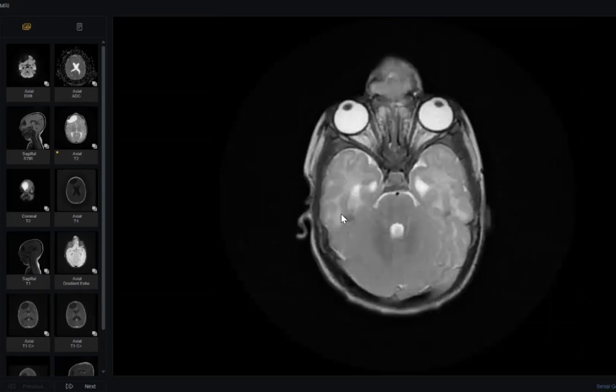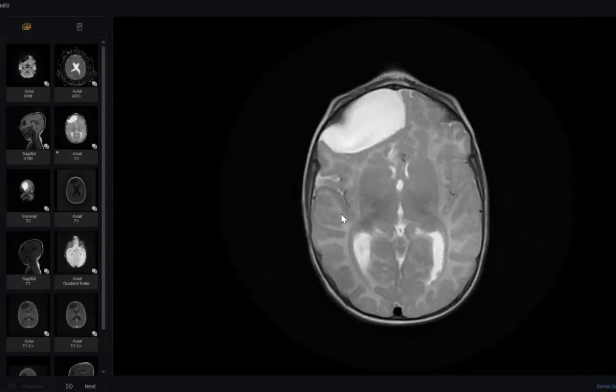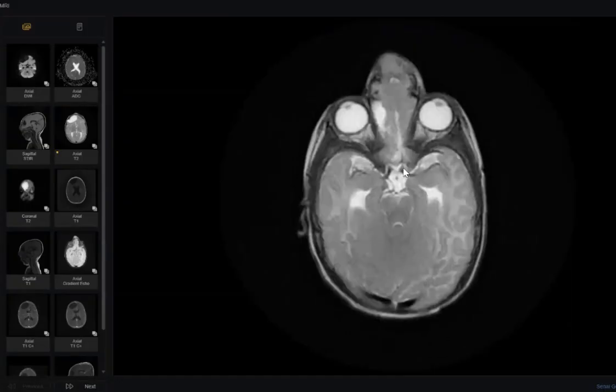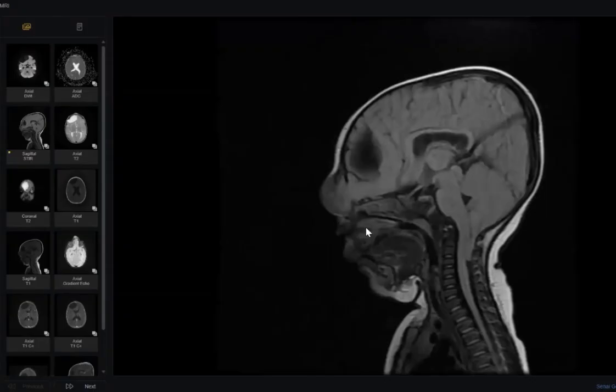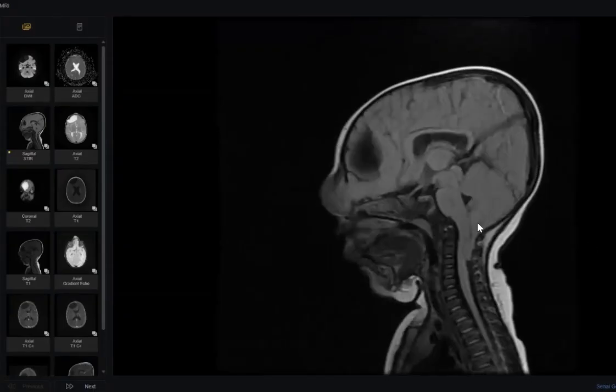Search for calcification in SWI or gradient echo or CT. But we have here a big disaster, herniation of the brain frontally, so frontal meningoencephalocele, and she didn't forget to talk about this herniation.